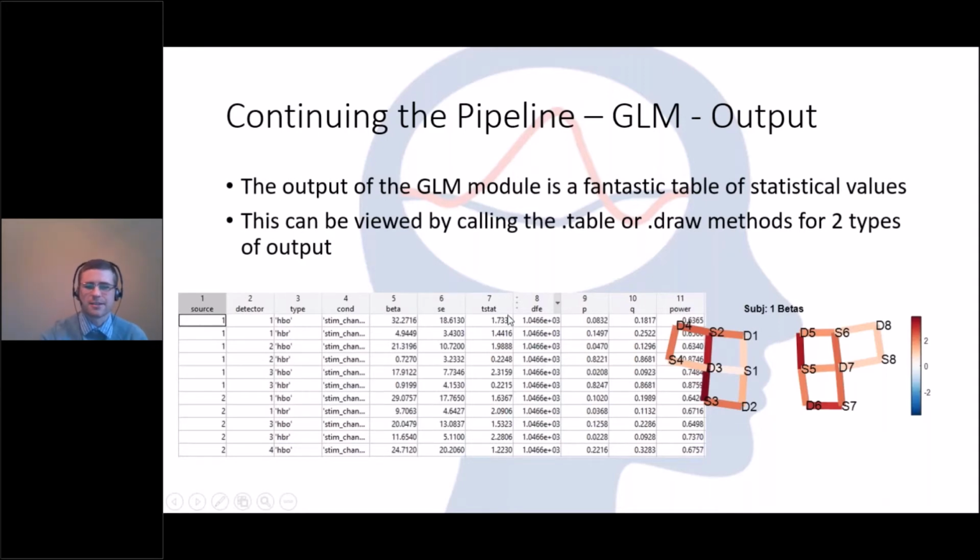The one catch is the T statistic is actually set as to how it's run. So if you want to change how it's set, I think it's actually run versus baseline. I'm not certain of that, but I'm fairly confident in that. If you want to change how that's run, we're going to cover that in a little bit. So you actually have to run it slightly separate.